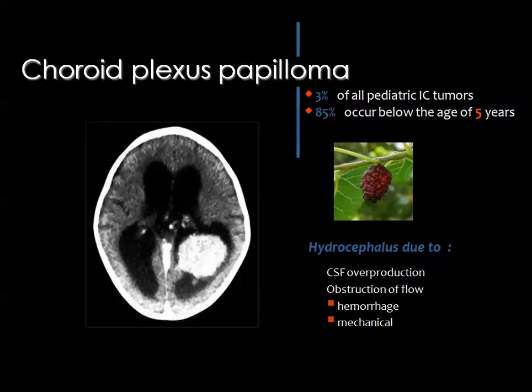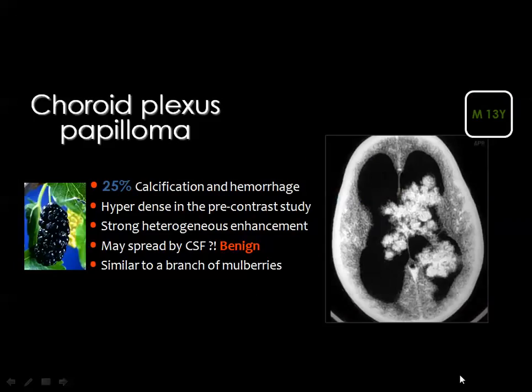But these tumors also can bleed and they can obstruct the CSF flow, so the hydrocephalic changes are augmented by an obstructive element as well. These tumors occur mainly in the lateral ventricle in the pediatric age group, and they are seen in the fourth ventricle in adults. Most of these tumors are hypervascular and they are liable to bleed, and also the choroid plexus usually develops calcification in adult age, and then also the choroid plexus papilloma and carcinoma can develop calcium.